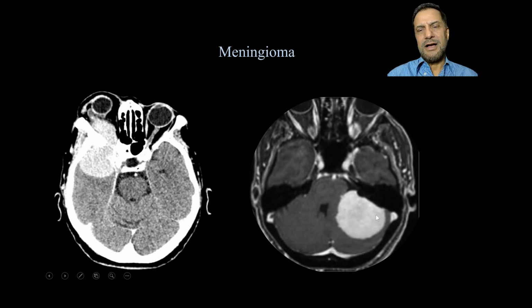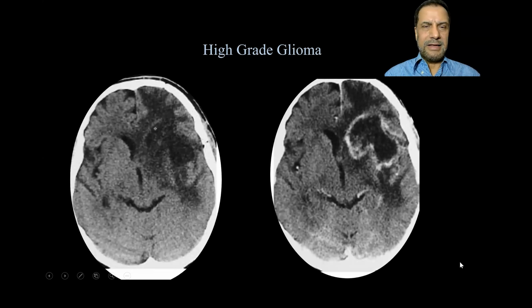Now, again, this is an image of an MRI, but I just want to show you that sometimes in a cerebellopontine angle, also you can see a meningioma like this, and the meningioma will have a broader base, so you need to differentiate between acoustic neurinoma, which will have intra-auditory extension into the internal auditory meatus, like a cone shape there, but in meningioma you don't see that.